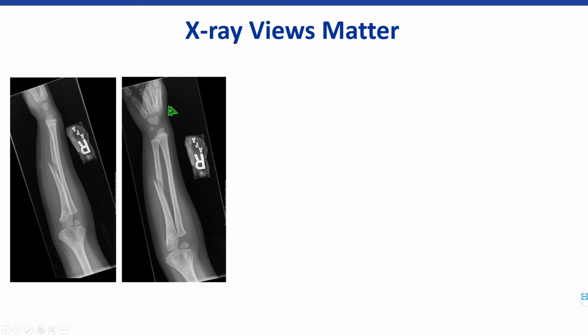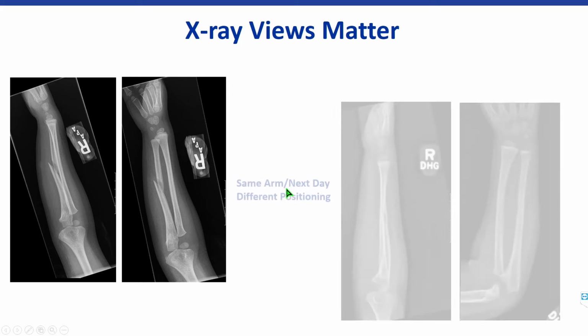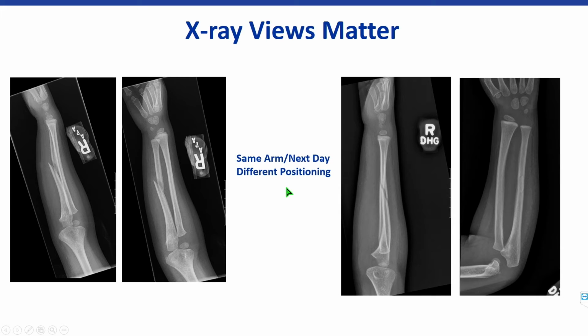Very similar case. Again, the hand tips you off that these positions are different, even though they look very similar. They're still pretty rotated. This isn't a terrible lateral. It's not perfect or ideal, but certainly gives you an idea of what's going on. Just a simple reposition, and we can further see how much that corrects, and that makes a pretty drastic difference.